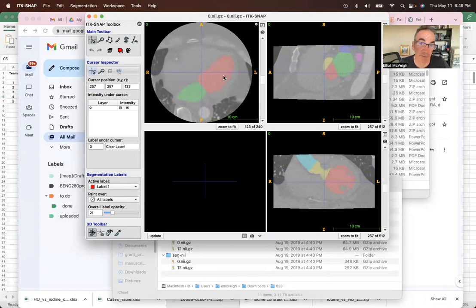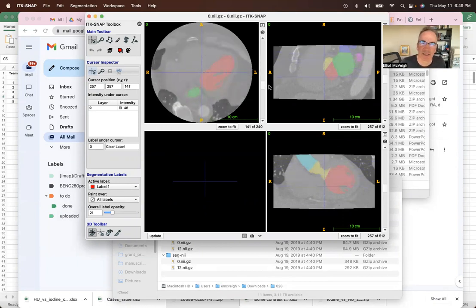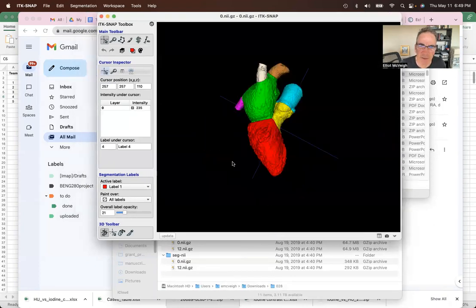This is obviously the left ventricle, and this is the left atrium label. This is the left ventricular outflow tract in yellow, and the aorta looks like it's an aquamarine color up here. These are all just integer values in the NIfTI file format that holds these segmentations. You update the 3D model, it should give you a picture of what that segmentation looks like.